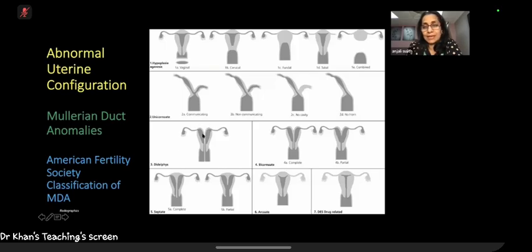It just dips in. It is heart-shaped. Same goes for bicornuate uterus, whereas in septate uterus, it has its normal convex contour. And so hysterosalpingogram has limitations in showing the fundal contour. So you have to ask for an additional imaging which can show a proper fundal contour.